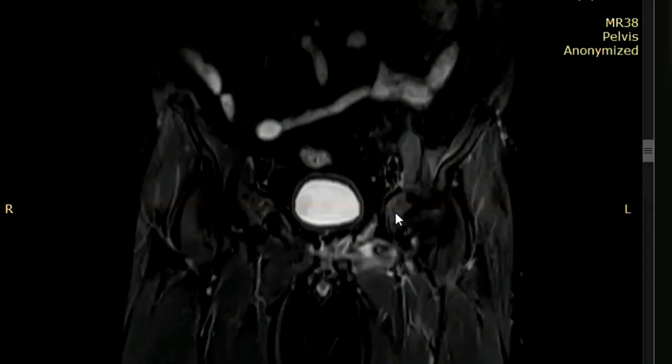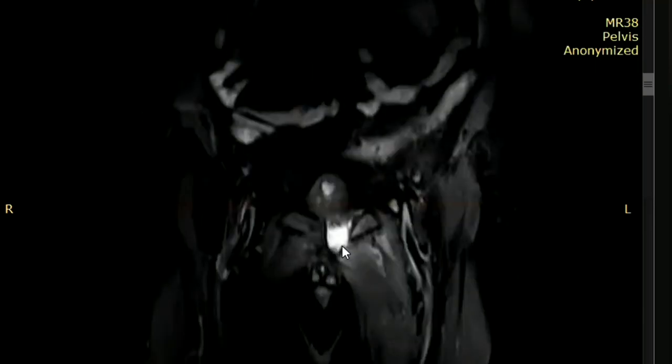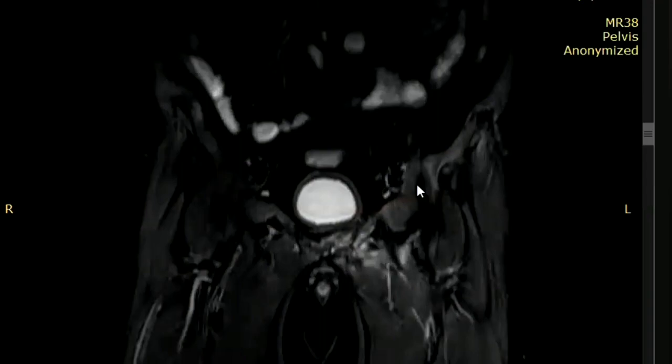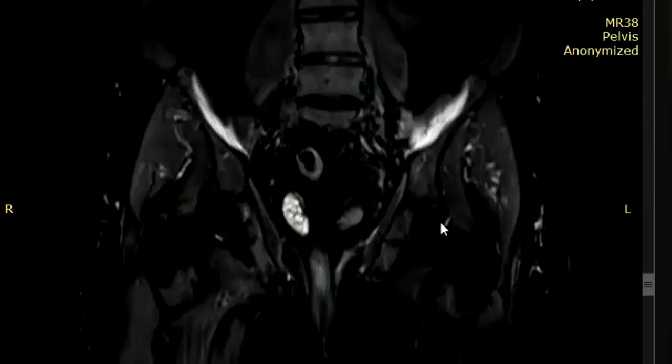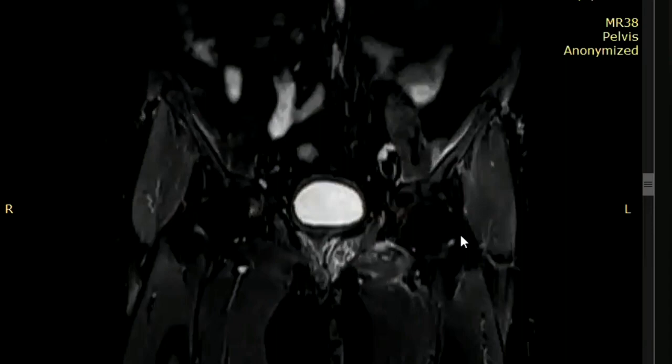Okay, ma'am. Can we get an infective etiology like tuberculosis, and differential like tuberculosis sacroiliitis, maybe involving the bones and joints? But tuberculosis would not cause a large lytic lesion with cortical destruction. And it will not be multifocal, one area here, then right sacrum, then left sacrum. The iliac bones are normal. This enhancement is there. This is actually in the iliacus bilaterally, right? Okay. Yes, ma'am.